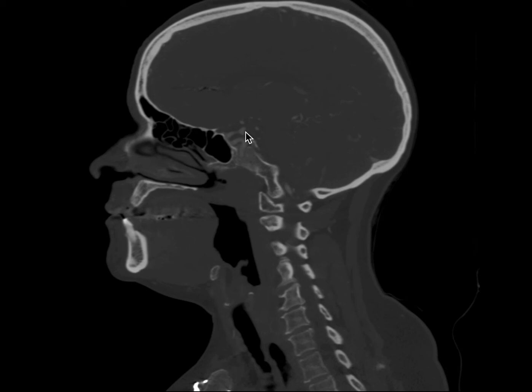If this thing were greater than 3 mm in size, or if the posterior communicating artery instead arose from its base, then it would be suspicious for an aneurysm, and follow-up CTA would be recommended. Infundibula of the posterior communicating arteries are very common, and are seen in about 7% of patients, though some sources say up to 25% of patients will have infundibula of the posterior communicating arteries.